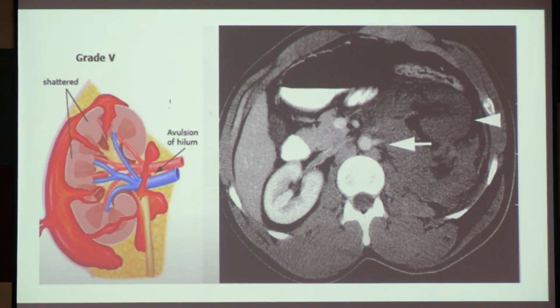This is something interesting. Can anybody say what has happened? The slides also say something, but can anybody say what has happened here? That is written, but can you interpret what has actually happened here? So first of all, this is a CT scan plate. It is a cross-sectional imaging of a CT scan.